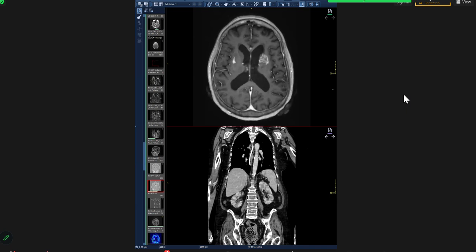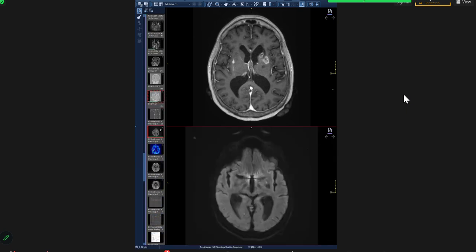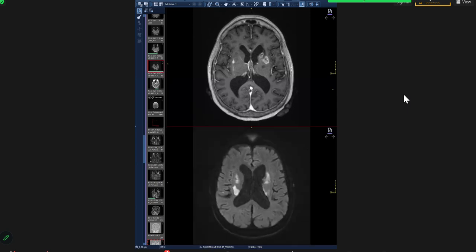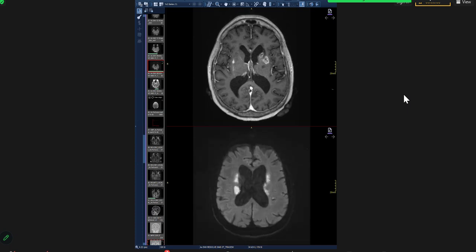You would not see an abscess like this. And this is more because you saw here the diffusion and all that. Sorry. So this was an infarct. And because they're different ages, we're quite confident that these are infarcts because the brain is not going to be this clean in an abscess, and you're not going to see so many abscesses concentrated.